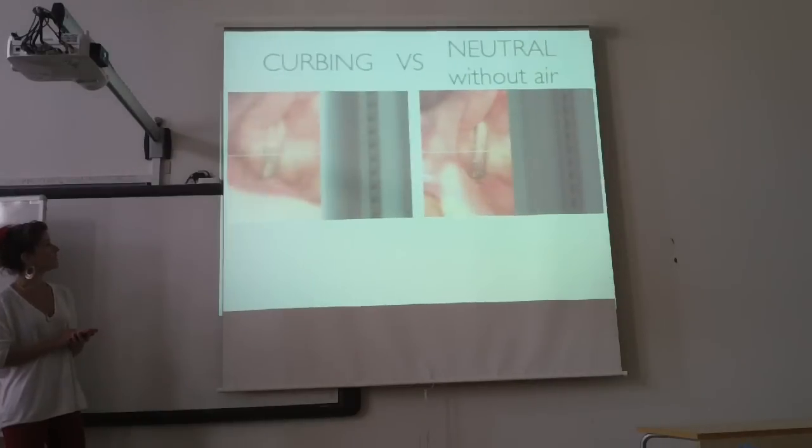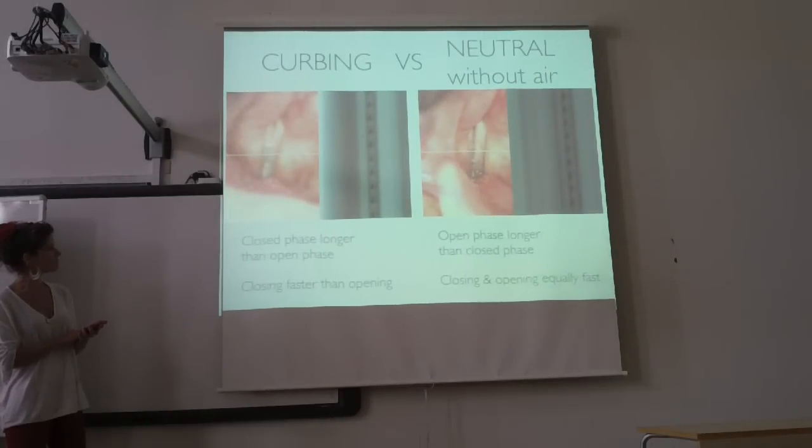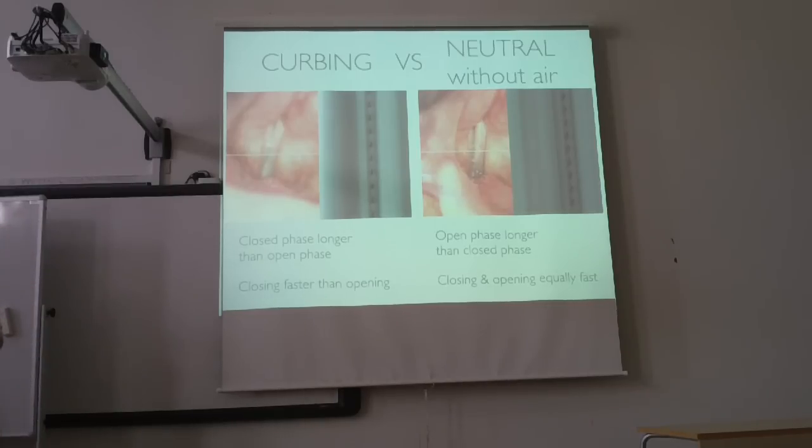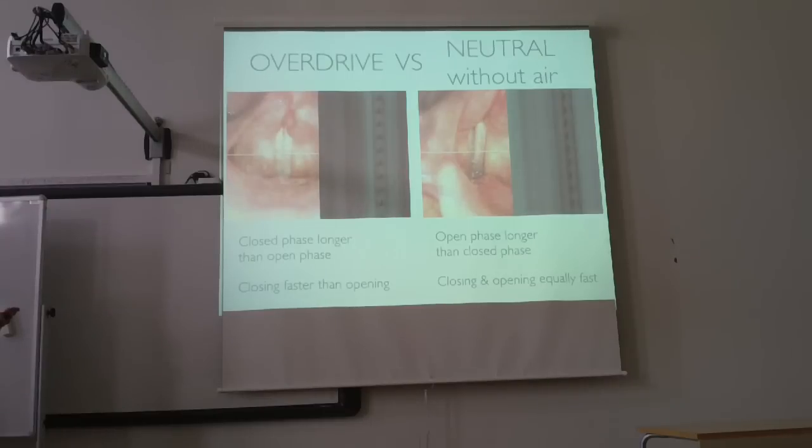When we look at curbing, this is what we see. The closed phase lasts longer than the open phase, compared to neutral, where the open phase lasts longer than the closed phase. And in curbing, the closing goes faster than the opening of the vocal folds. When we go to overdrive, we see the same thing, same conclusions.